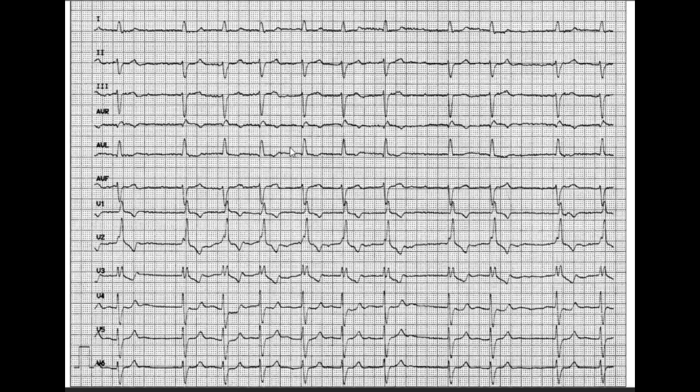Okay, so now the QRS. The QRS, as you can see, is very prolonged. It's actually 0.15 seconds, so we cannot calculate Sokolov's index here. The Q waves, nothing. There's no weirdly shaped Q wave, so we'll skip that.